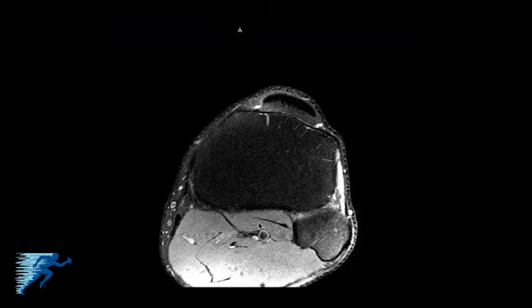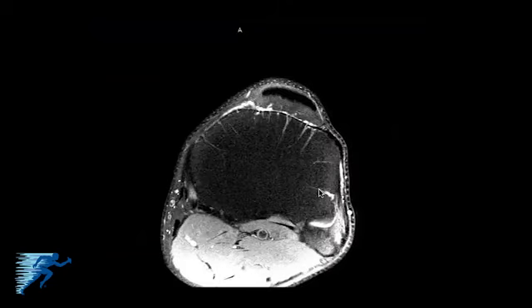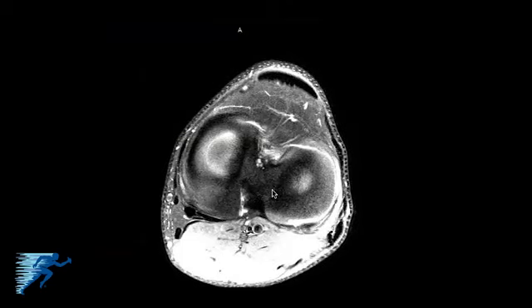This will be the popliteus muscle along here, and you can see how close the popliteal artery is posterior to it. The posterior superior proximal tib-fib joint ligament is right here, and as we start to course more, we'll have the anterior ligaments for the proximal tibial fibular joint at this location. As we start to get close to the joint, we'll see the outlines of the menisci, and we look for little ghosting signs along the edge here to see if there's a small radial tear that the sagittal and coronal films may not have picked up.